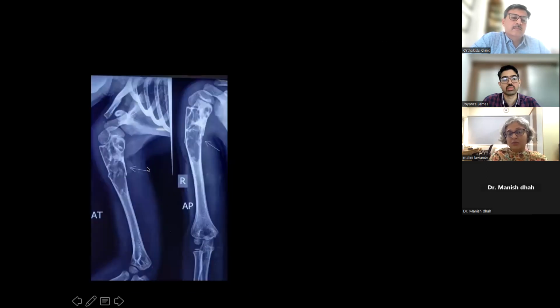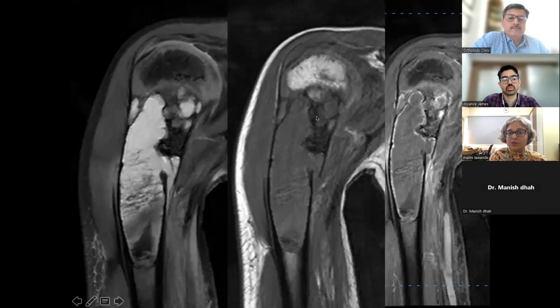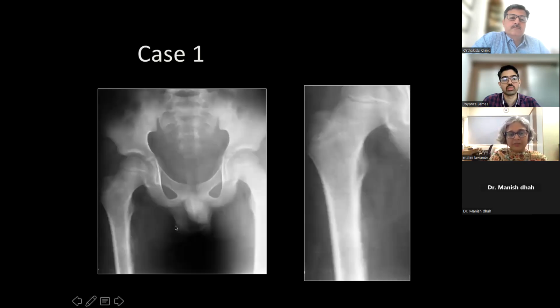Another lesion now looks a little more trabeculated in appearance. There's a pathologic fracture. Again, because of the fracture you have hemorrhage, but otherwise this is still a simple bone cyst. You have just simple peripheral enhancement. This heterogeneity is because of the hemorrhage. So you can have these atypical appearances of SBC, and one may do an MRI to confirm it.